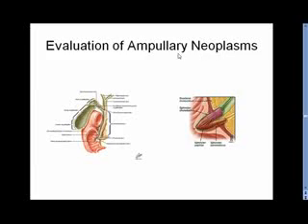Endoscopic ultrasound is also a very good modality, or maybe one of the better modalities, to evaluate ampullary neoplasms. Just to remind you of the anatomy, here's the bile duct and the sphincter of Oddi, which actually has 2 components, a very small, smaller circular muscle in the pancreatic sphincter segment, and a much larger one in the bile duct segment, and then obviously here the external papilla.